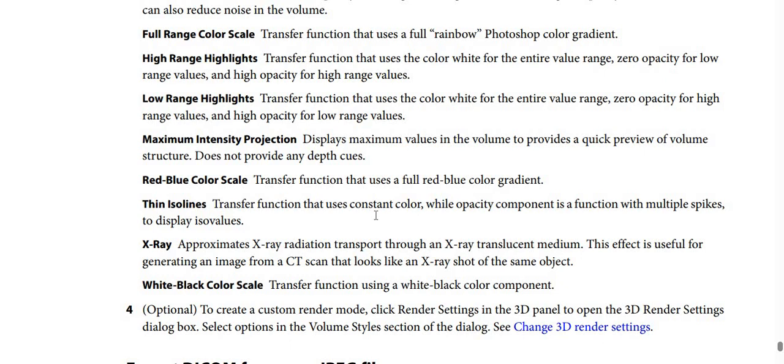After that, maximum intensity projection. It displays maximum values in the volume to provide a quick preview of volume structure and doesn't provide any depth cues, by the way. And after that, red blue color scale, a transfer function that uses a full red blue color gradient.